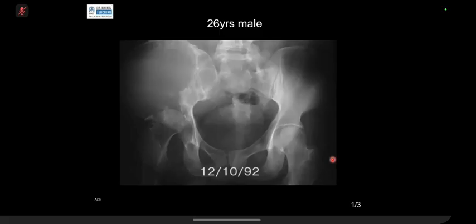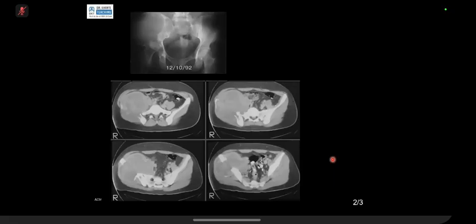Besides this, I think there is a large lytic area in the right iliac bone. So I think that is possibly because of a hemophilic pseudotumor, or there can be other DDs as well. But yes, that's the large lesion which I was seeing in the right iliac blade, right iliac bone. Sorry, on the CT, yeah?